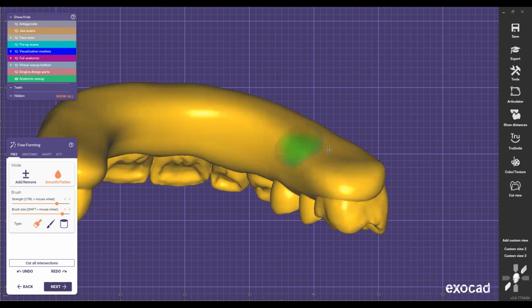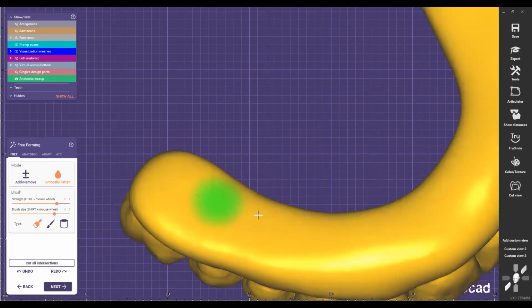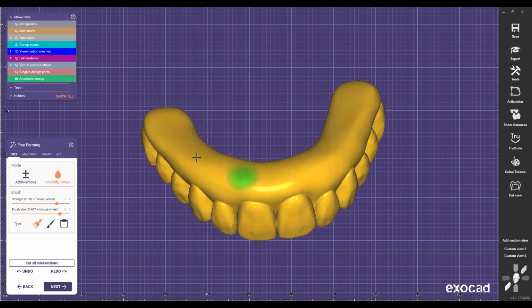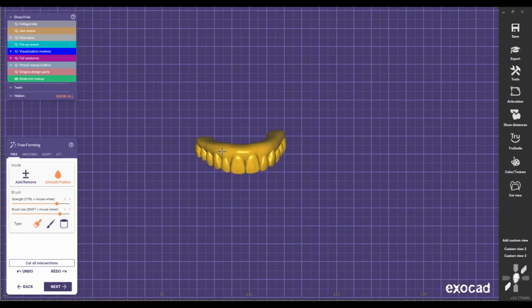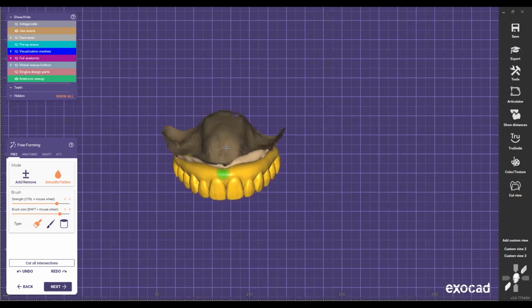It's because of our design, and that's very important for technicians to notice when we're designing these cases, right? Understanding biology makes everything so much easier when we go to finals, because now we have nice tissue, and the tissue is going to adapt to this one, and now when you take it out, it looks beautiful there. You just make it much easier for us, right?